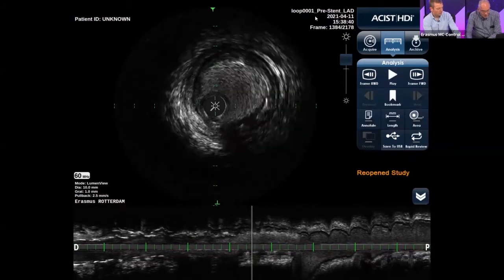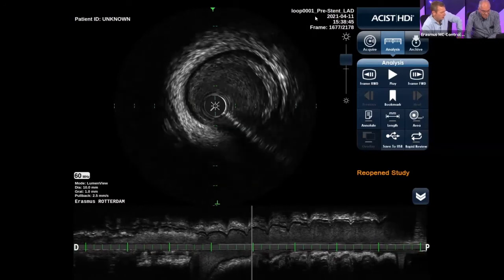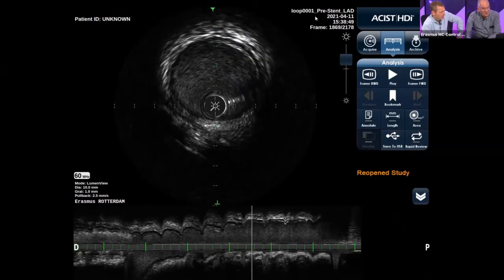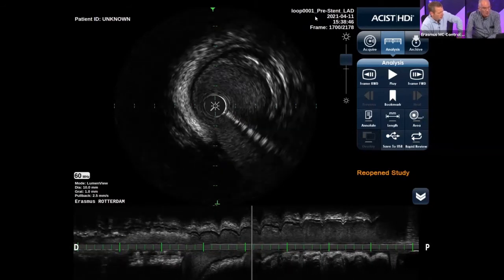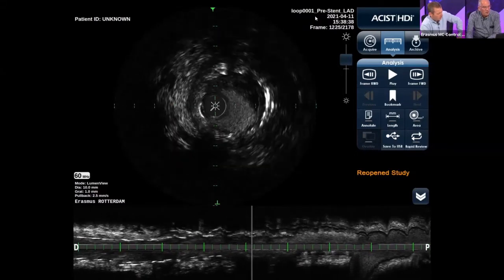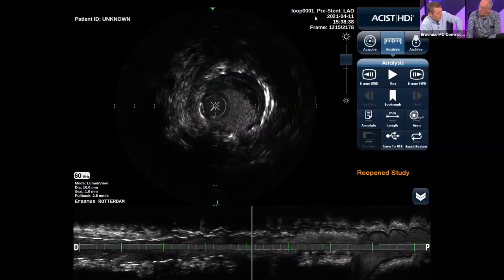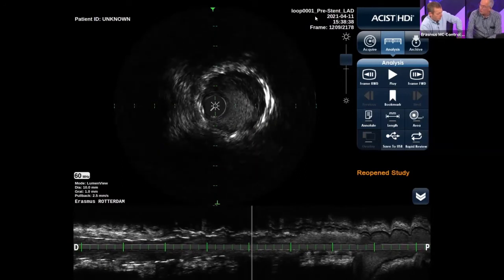But what is key here, indeed, is that this is late stent thrombosis mainly because it's within a year after stent implantation. But the key thing is that within the stent, you see only thrombus. That's no neoatherosclerosis, meaning there's no excessive neointimal tissue, no calcium, and no neovascularization. So this is absolutely just thrombus. And this thrombus was already there. It has been developing for some time. And then the last part came.